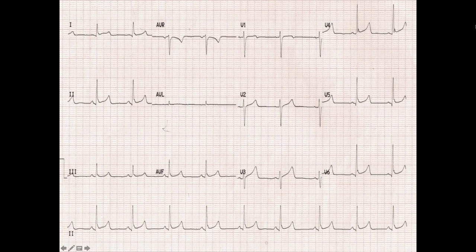But what does this concave upward sloping into a T wave look like? Well, it looks exactly like this. We have a little bit of ST segment elevation. So at first glance, you might think STEMI, just at first glance. But if we look at it for another 10 seconds, we see that it's all over the place. It is in just about every single lead. aVL, not so sure of, right? Maybe a little bit. aVL super small. But we've got this scooping, sloping, even aVR, it's going to be a negative slope, a negative scoop into the T wave. So it is everywhere.